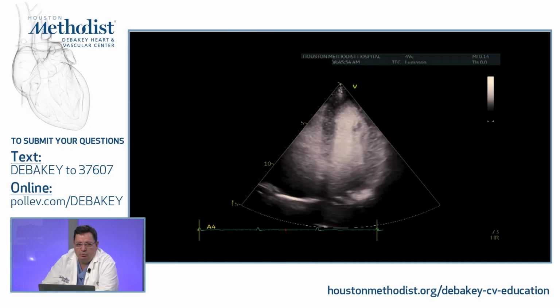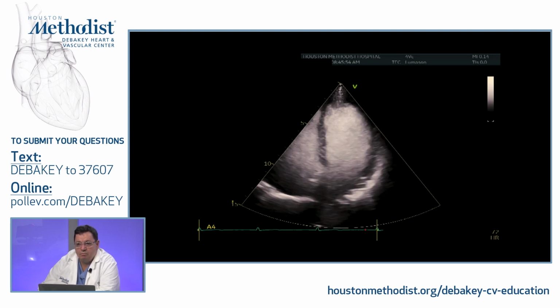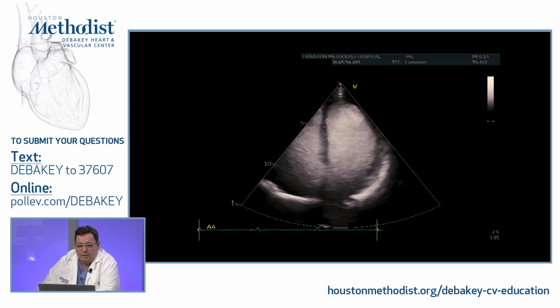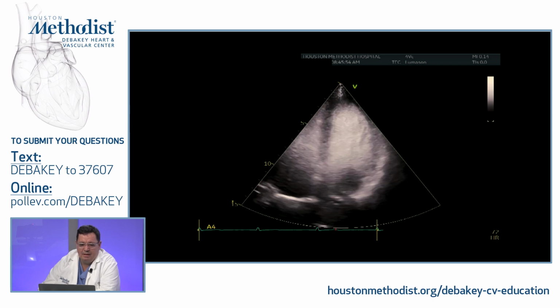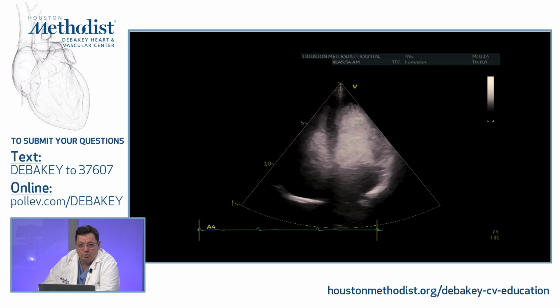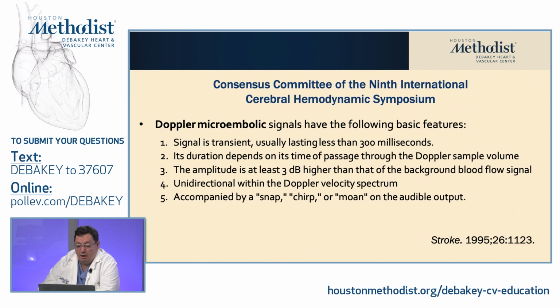So I just want everybody to be aware of this: when you see these, don't give heparin right away and don't yell for embolization. First, just check, make sure the patient did not have an echo done with the contrast agent, because this is how the contrast is going to show up. And again, just a few slides about the consensus.